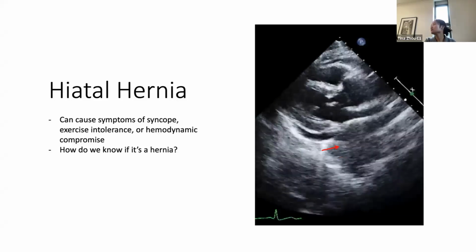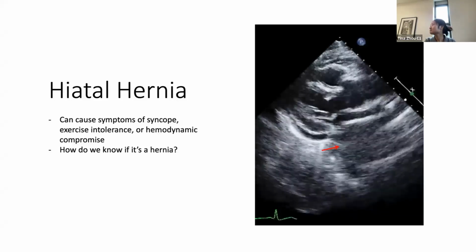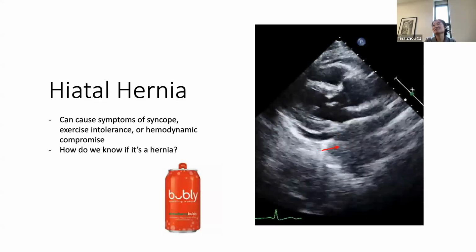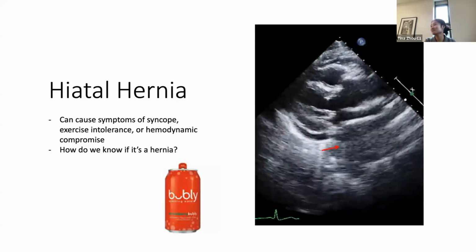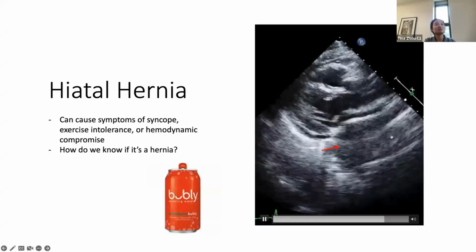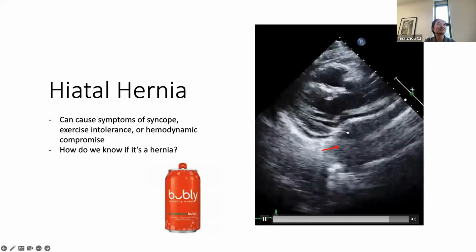But the question is, how do we know if it's a hernia? Yes, exactly. It's a different kind of bubble study. Just give them a little bit of soda. You should see bubbles in the stomach rather than in the heart.